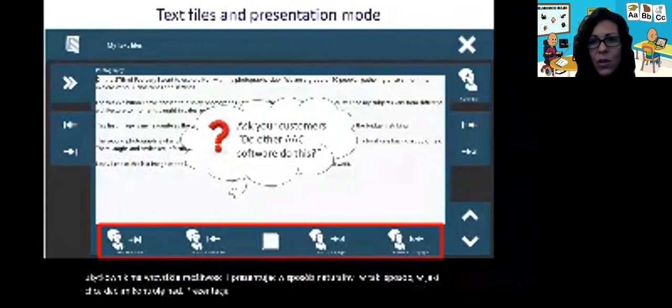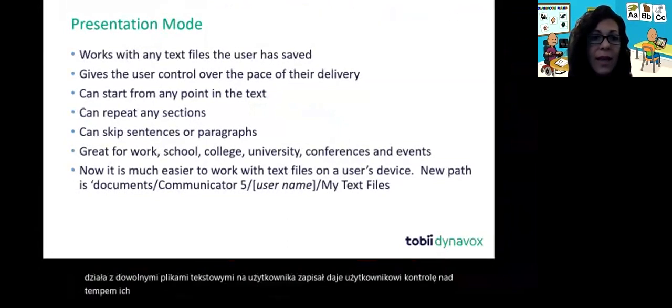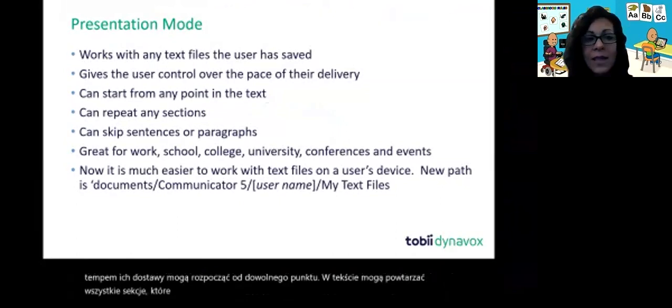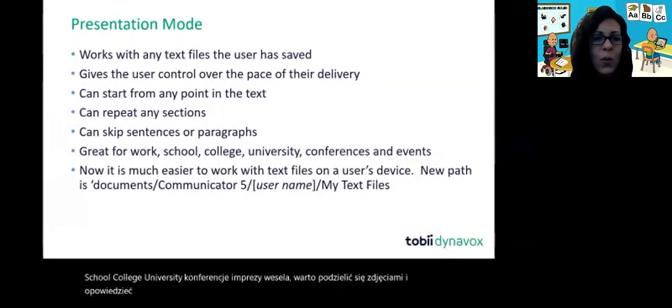So that's one of my favorite tools, and we'll just summarize: presentation mode works with any text files that the user has saved. It gives the user control over the pace of their delivery. They can start from any point in the text. They can repeat any sections. They can skip sentences or paragraphs. It's great for work, school, college, university, conferences, events, weddings. You know, at weddings, you might want to share some pictures and tell a story, and again, you can use presentation mode to do that.